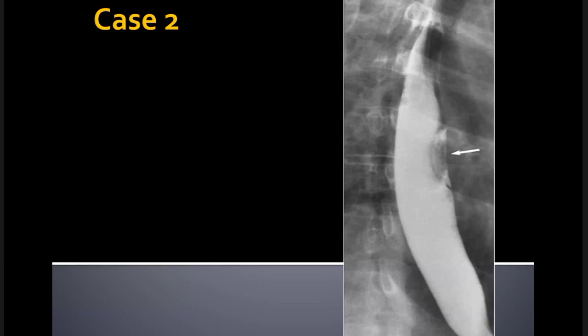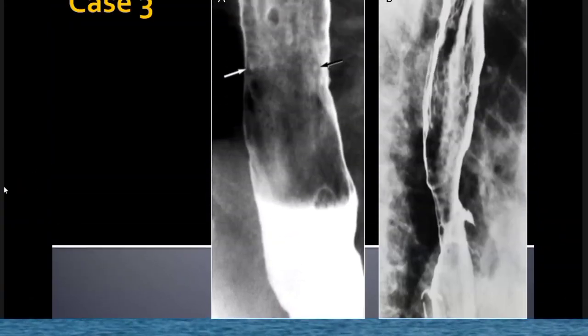They tend to be large and quite flat, as you described, and solitary as well. They tend to be single, and you quite rightly mentioned that with herpes, they tend to be multiple, smaller and a bit more punctate. Okay. Thank you.